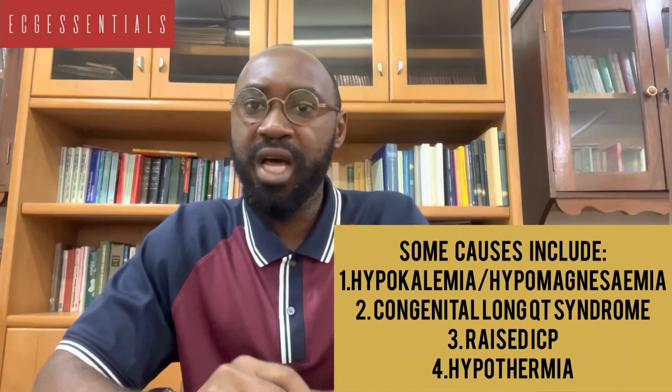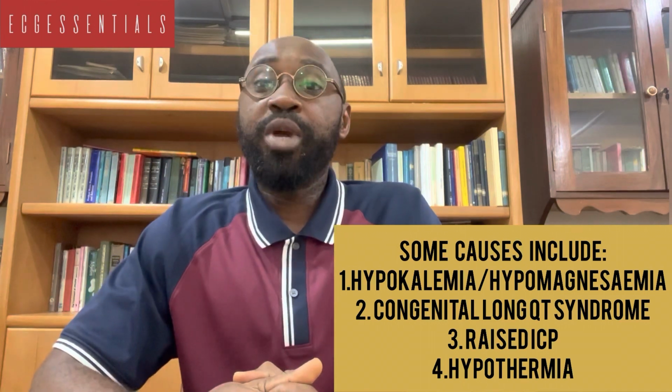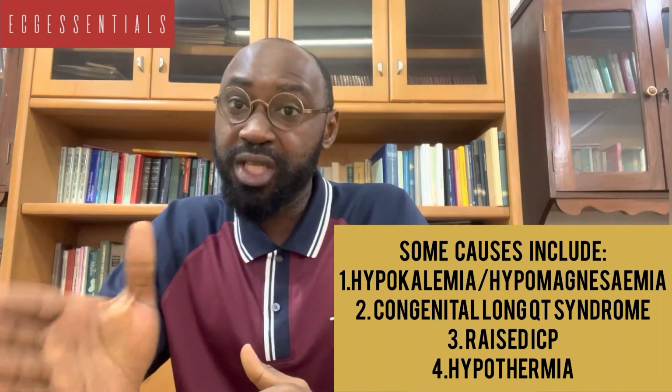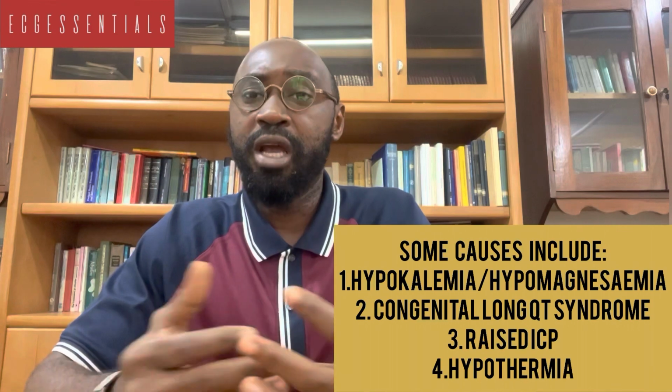Some possible causes of prolonged QTC will be electrolyte imbalances, for example, hypokalemia and its cousins, hypocalcemia and hypomagnesemia. We can also find prolonged QT in congenital long QT syndrome. Sometimes too, we may find it in conditions like raised intracranial pressure, severe hypothermia, and all of that. So it is important. I know a number of us may not be very interested in looking at the QTC, but it is important for us to look at it because it gives us some vital information.